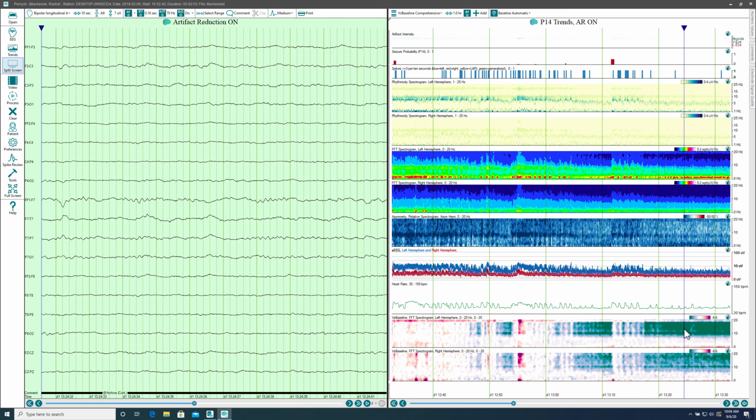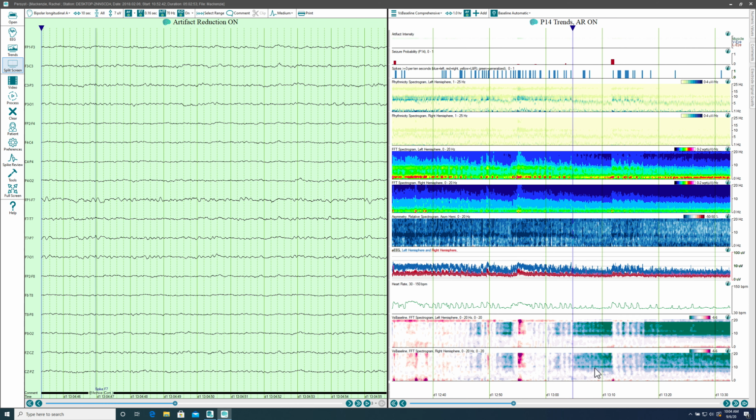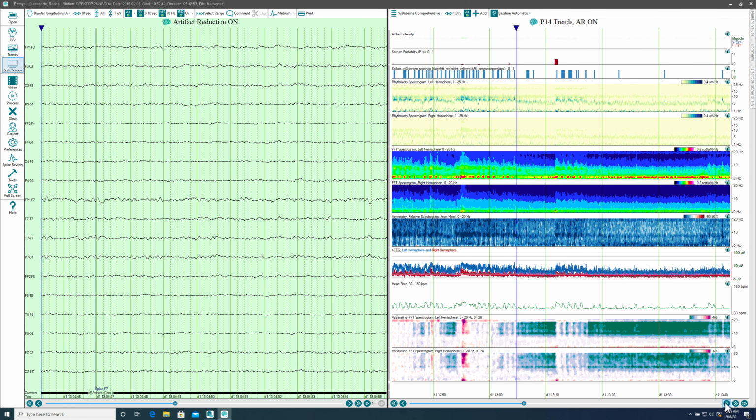Due to the stroke, the patient was obtunded, and so any clinical changes that corresponded to the changes in the EEG may have been difficult to detect at bedside. Despite the fact that we can clearly see the extent and significance of the change in the versus baseline trend around 1305, it wasn't until roughly 1400, 55 minutes later, that the clinical team suspected that the patient was possibly becoming less responsive and that it might be due to increased intracranial pressure.